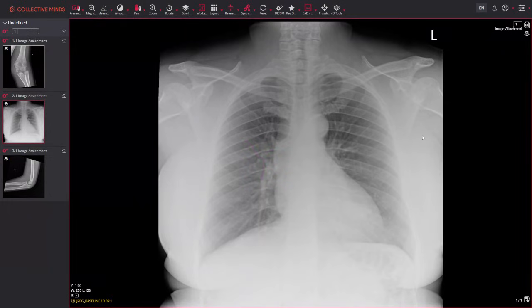The main thing for you guys, I would say, with the hilar regions is just look for any difference in density between the two. Can you distinguish the vessels coming out clearly? If one hilum looks denser than the other and it looks more lobulated, if you can't see those vessels, then that implies there's either lymph node enlargement or a mass, either at the hilum or posterior to it in the upper lobe.